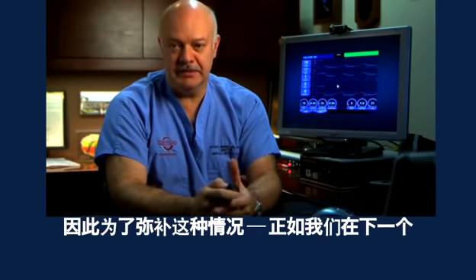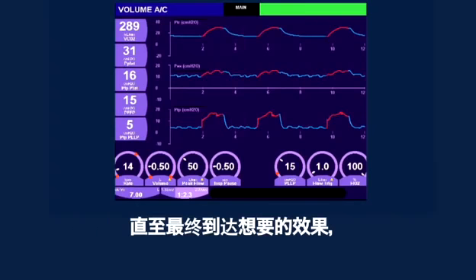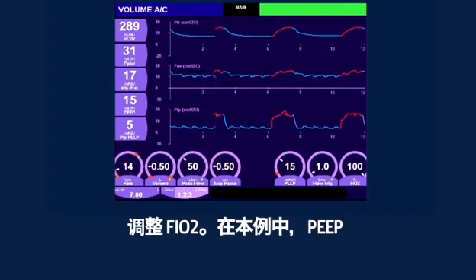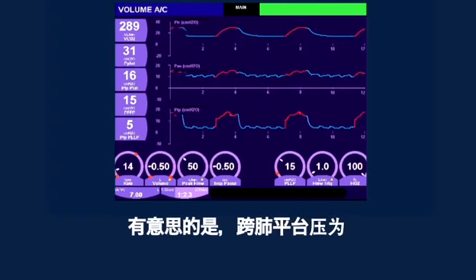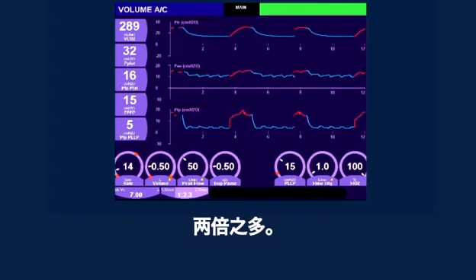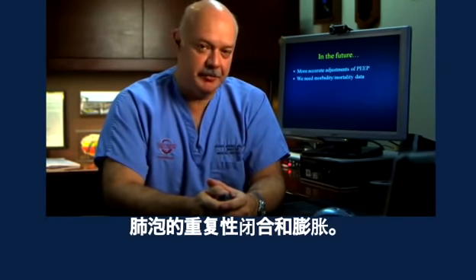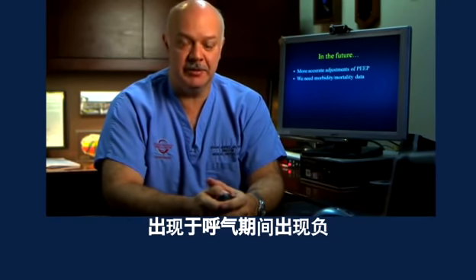So in order to compensate for that, as we see here in the next model, you have to adjust the PEEP in increments until you eventually get the desired effect, in which the saturations improve and you can adjust your FiO2 as well. In this example, we have reached a PEEP of 15, which has a transpulmonary pressure of 5. Look how interesting it is that the transpulmonary plateau is 16, whereas the measured plateau is 32. It's essentially twice as much. This is an interesting strategy to decrease the repetitive alveolar closing and expansion, the atelectrauma that we hypothesize is seen when we have negative transpulmonary pressures at the end-expiratory phase.